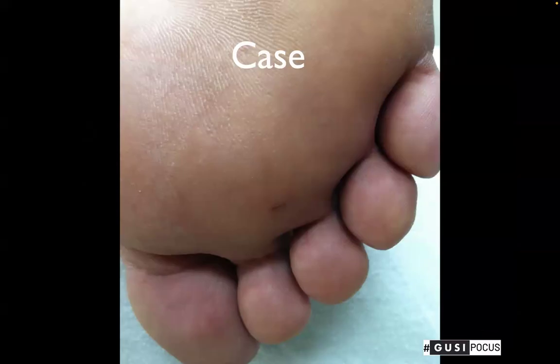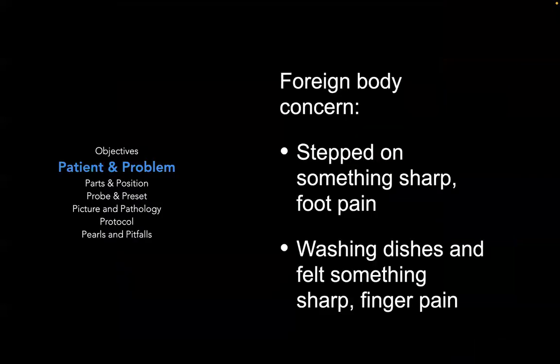In the case of primary care, it is so common to see foreign bodies in the foot, in the hand, when someone is washing dishes and a glass plate breaks, or if there's a splinter that gets into the hand or the feet, or they're walking barefoot along the beach. And so this is a common scenario. It is also an entity where point of care ultrasound is really helpful to evaluate this. I have to say though, with the Butterfly ultrasound probe, the resolution is a little bit limited.